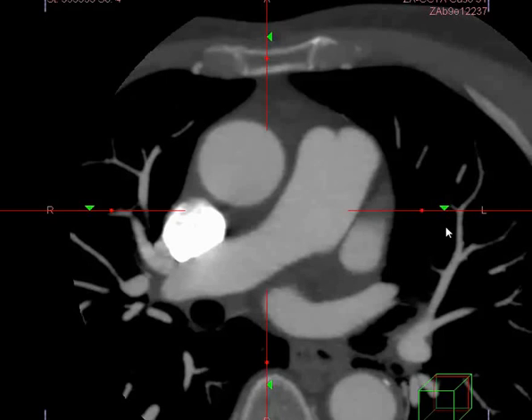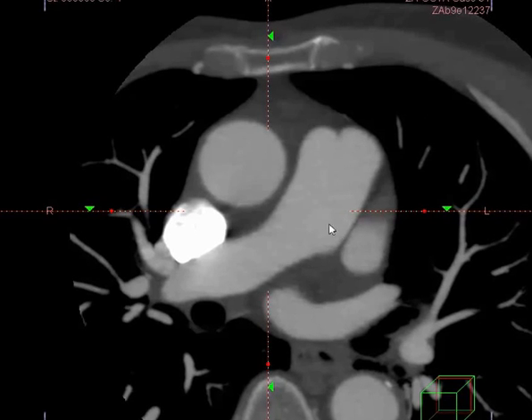This is a single-phase image, and even though you will clearly see there is some coronary disease and some atherosclerotic plaque, the single phase for this study is insufficient to completely evaluate the coronary arteries. In this example, we're now looking at the other characteristics that the electrophysiologist would like to know prior to proceeding to pulmonary vein ablation. The first thing is they want to look at the left atrial appendage.